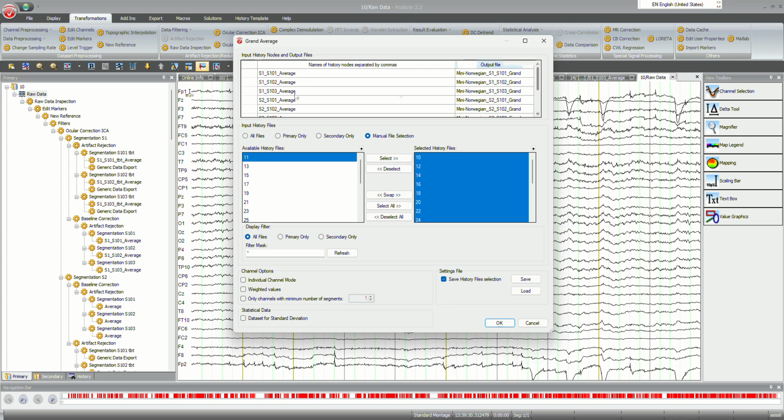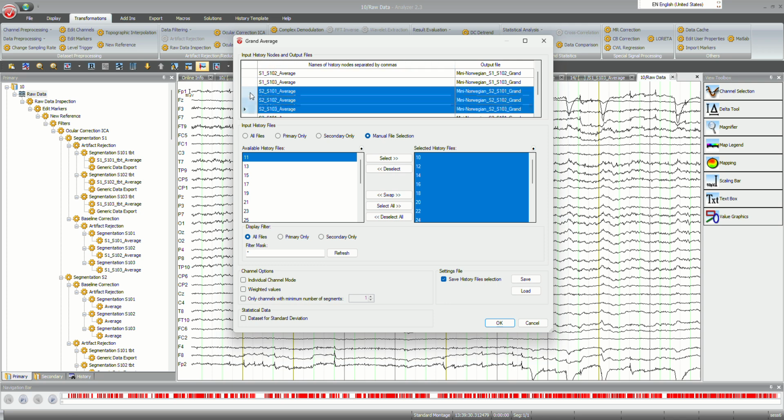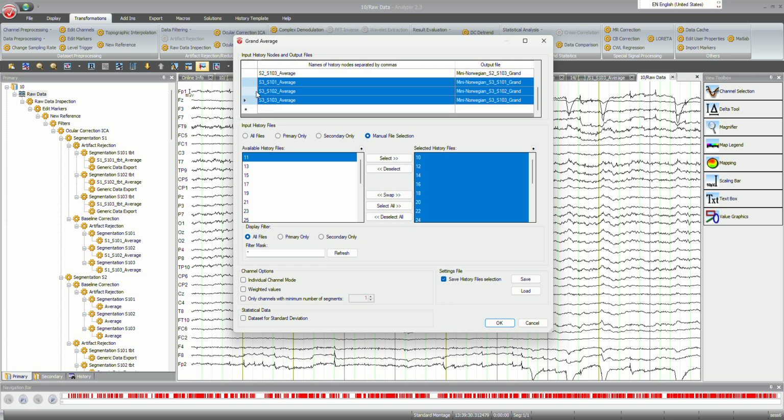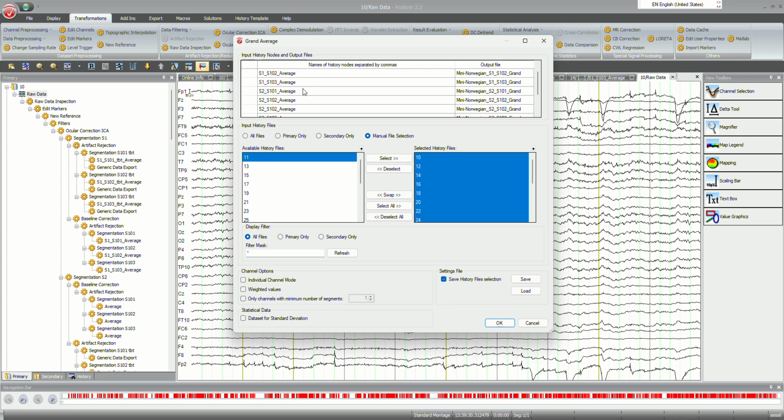So essentially, for the first grammatical property, S1, second grammatical property, S2, and last grammatical property, S3, each of these with their three grammaticality conditions. Okay, so this is all ready.